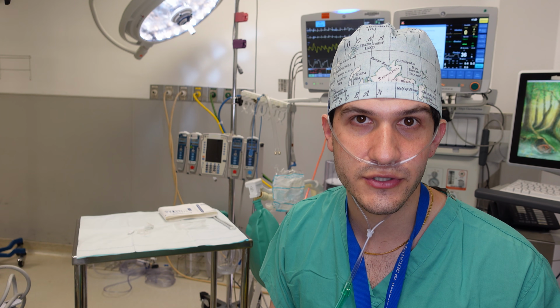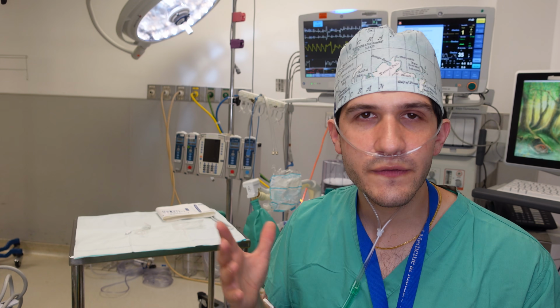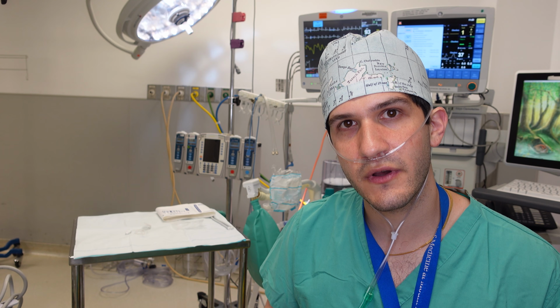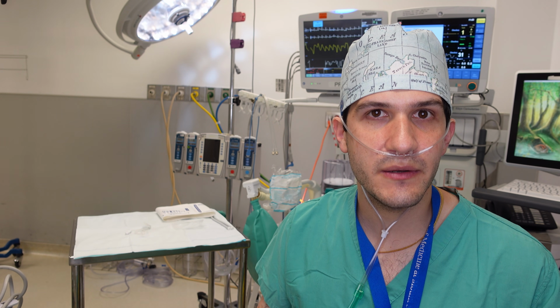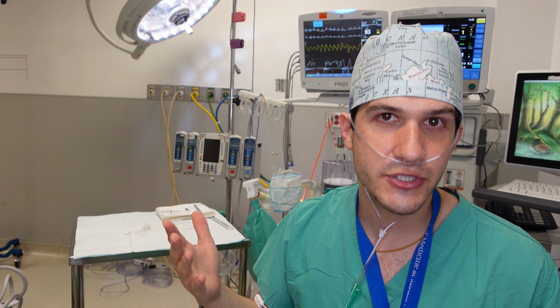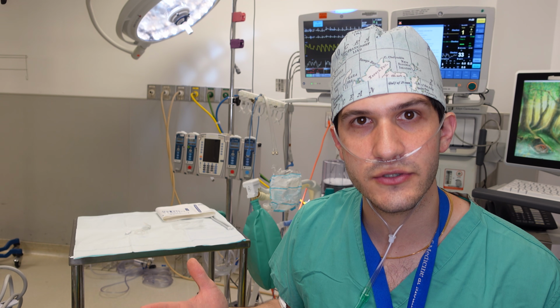Next is blood pressure monitoring. And categorically speaking, there are two different ways that we can go about it. One is non-invasive blood pressure monitoring, which is probably what you're used to, which involves a blood pressure cuff being put around an extremity and then being able to pick up on pulsations of an artery as that artery is being squeezed and then let go. And then the machine is able to determine what the blood pressure is based on how those pulsations occur.